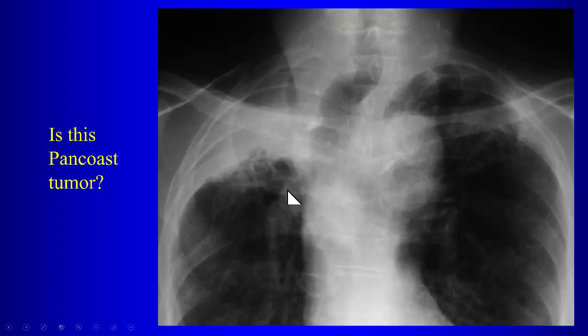Is the left lung normal? Also, the trachea shifted over, which also tells you there's volume loss in the right upper lobe. Is the left lung normal? Well, are these opacities normal here in the left lung? No. Okay, so we have some abnormal opacities, and what part of the left lung is involved with these opacities? Left upper lobe, right? Especially towards the apex. You see these funny looking things over here, right? Yeah, so that's bronchiectasis.